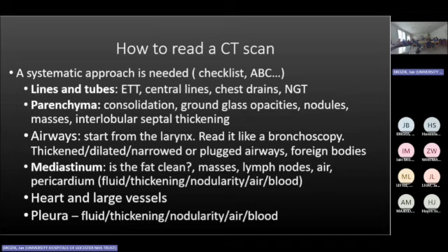We have an artifact when the non-contrast blood and contrast blood are mixing, it actually might give the impression there is a clot. It's like two big rivers at their confluence, they still flow for a couple of miles. You can distinguish the colors.